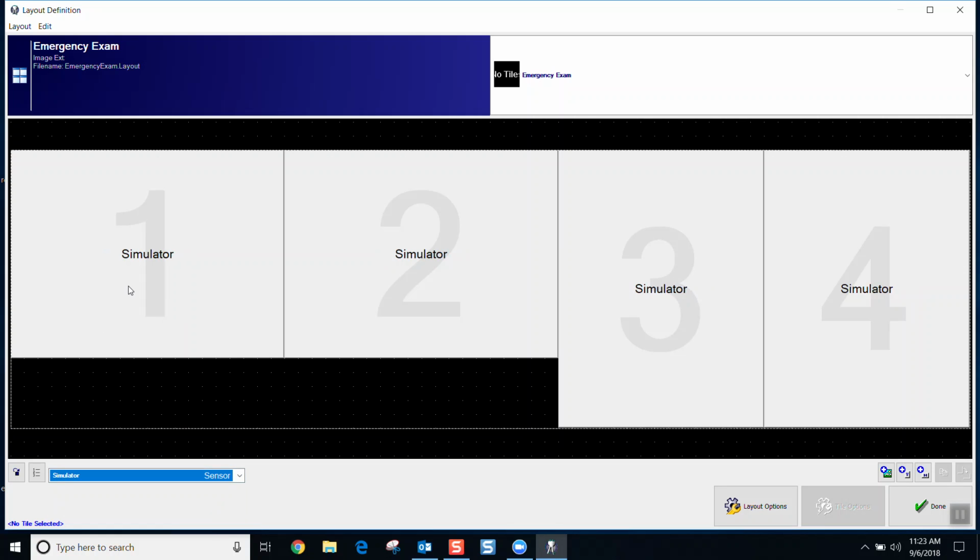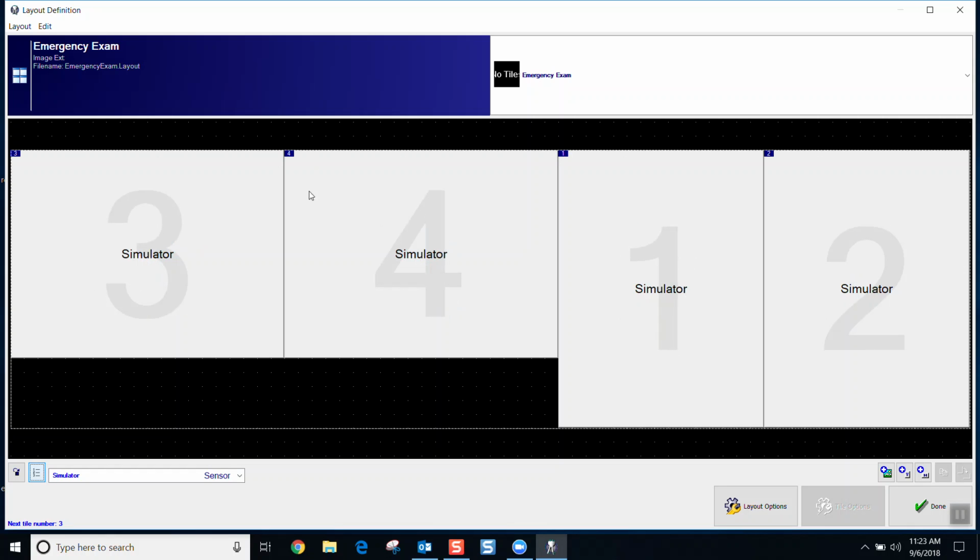If I wanted to change the flow, if I wanted to start with my anterior teeth, let's say, this 1, 2, 3, clicking on that allows me to then click on number 1. I would want that to be number 2, and that would follow suit, or I could pick 3 and 4 that way.